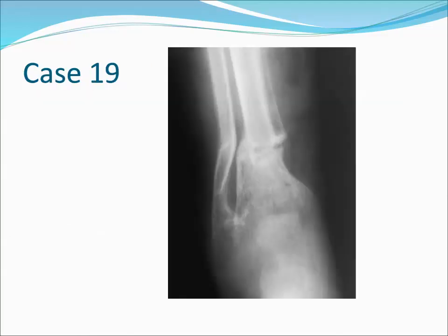Case No. 19. A horizontal fracture of the tibia and the fibula is present in this child with osteomalacia, rickets. Fractures of this type are called Looser's fractures and are virtually pathognomonic for osteomalacia, however, they are rarely seen. Findings of Looser's fracture, reason osteomalacia.